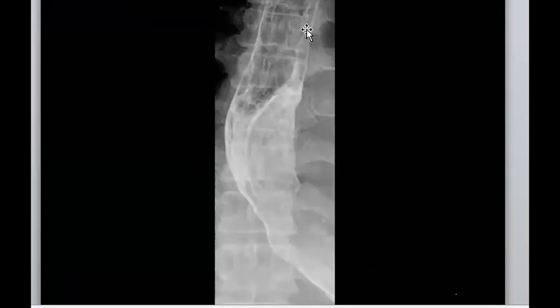You can see this mucosa here, and it is elevated, right? Elevated mucosa, as you see here. So that means that the wall itself has the lesion, and the mucosa is not affected. But when the angle with the wall is obtuse, yes, also the angle is obtuse, perfect.